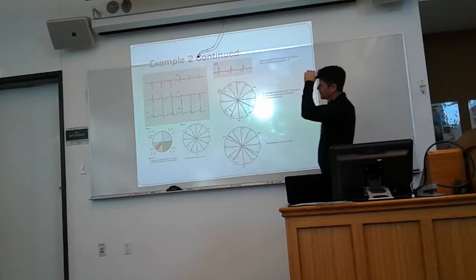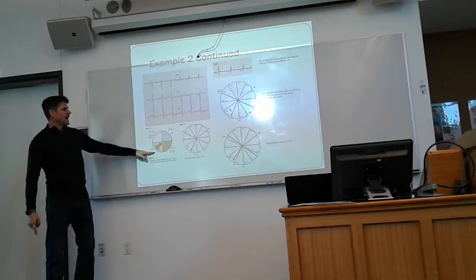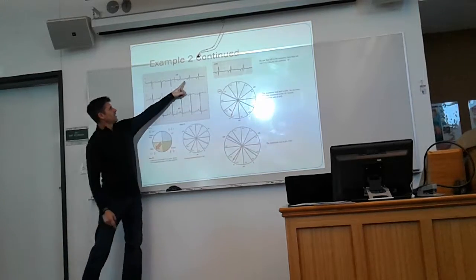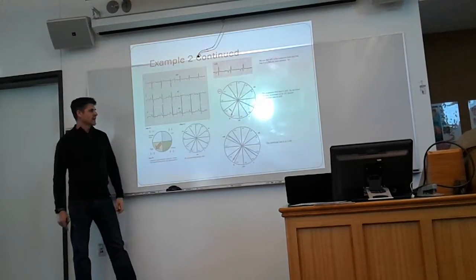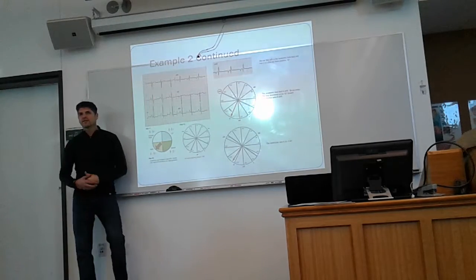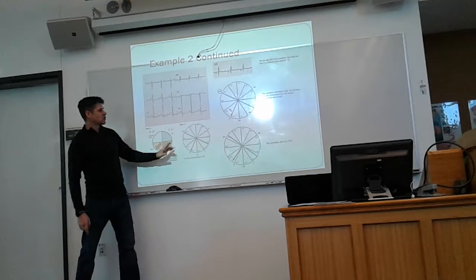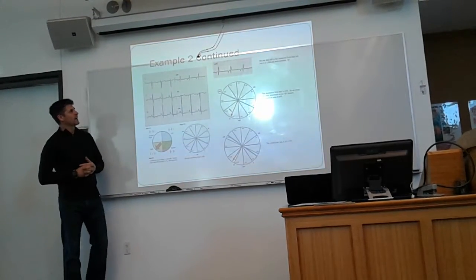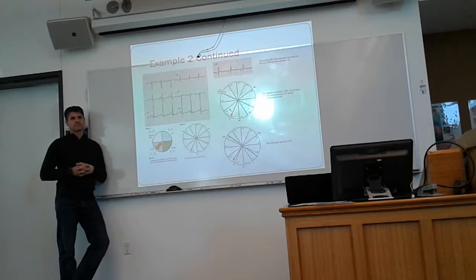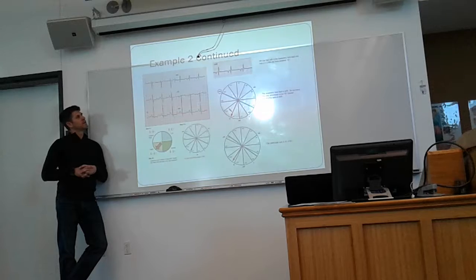So we looked at this example. Lead 1 was negative, AVF was positive, so we're in the right axis. We found AVR is the biphasic lead, so we put our T on AVR and it's pointing down. AVR is more positive or more negative? More positive. So we are going to shift it towards AVR. And is it a lot more positive or a little more positive? A lot more. Than it is negative, I mean. Almost double.